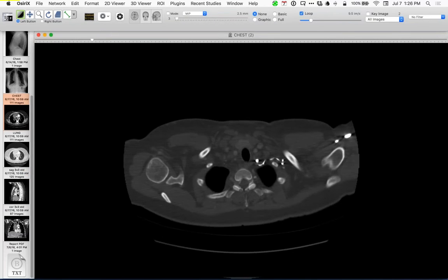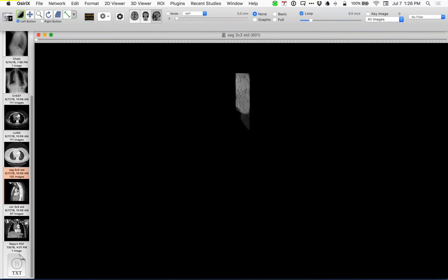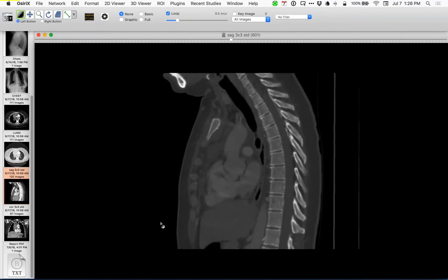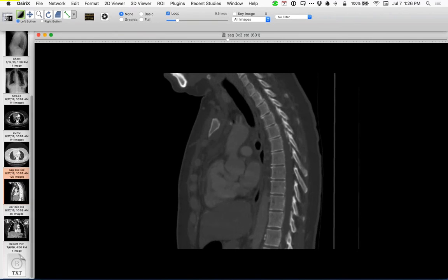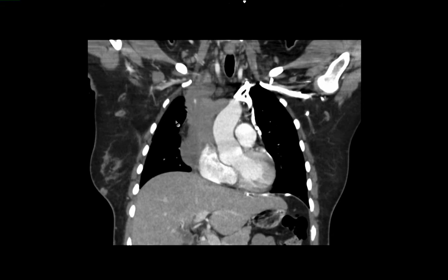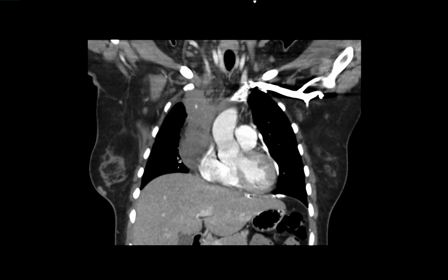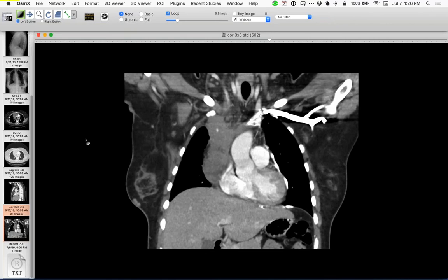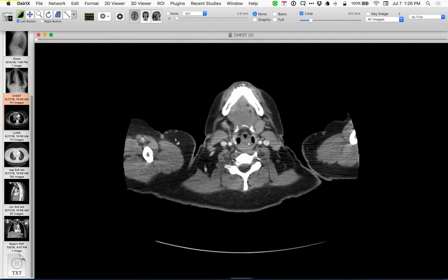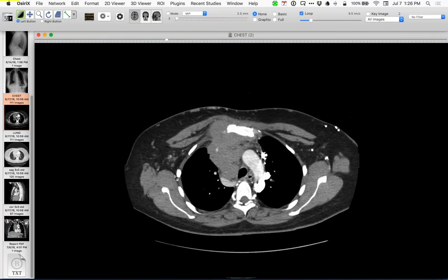But Howard, that's interesting, because usually the shunts that we see when you have collateralization into the pulmonary veins, I always think of it, and I think most of the cases we've shown, at least you and I, have been in more long-standing SVC syndrome, like end-stage renal disease patients. But presumably this is more of a, not acute, but maybe subacute as this mass has enlarged. Yeah.